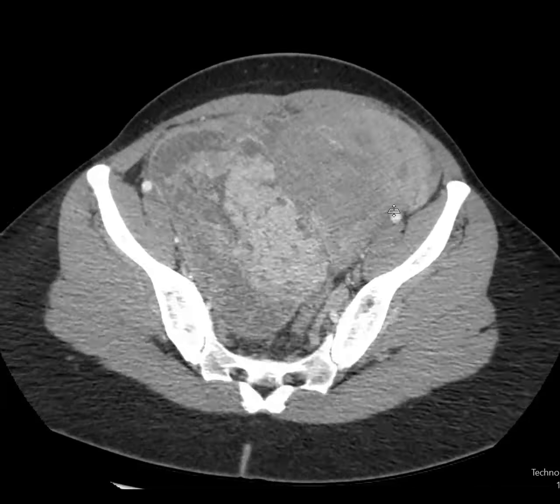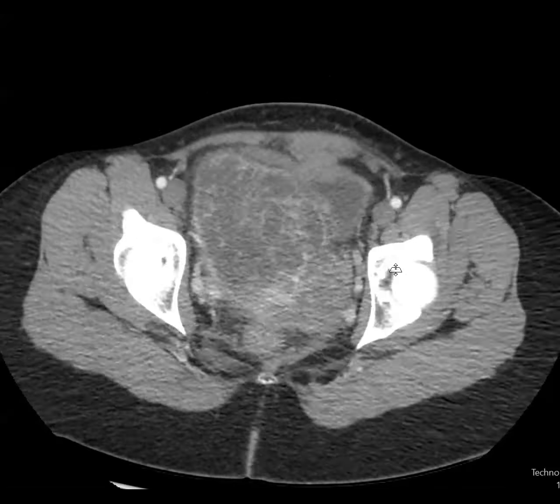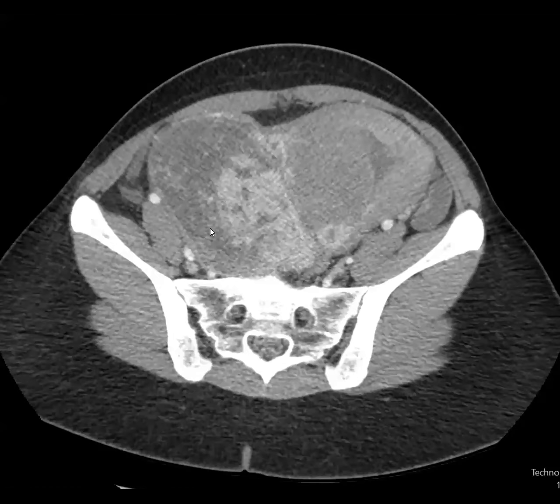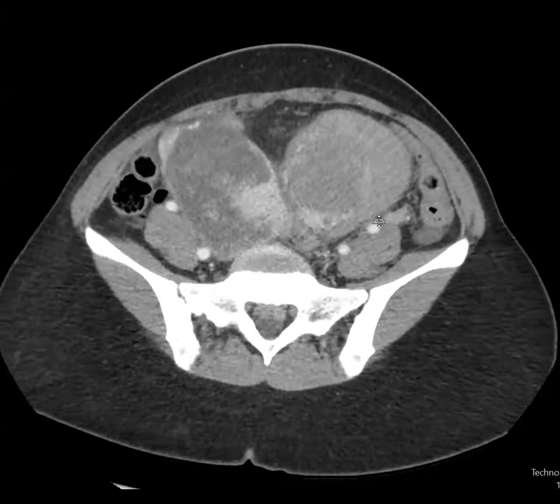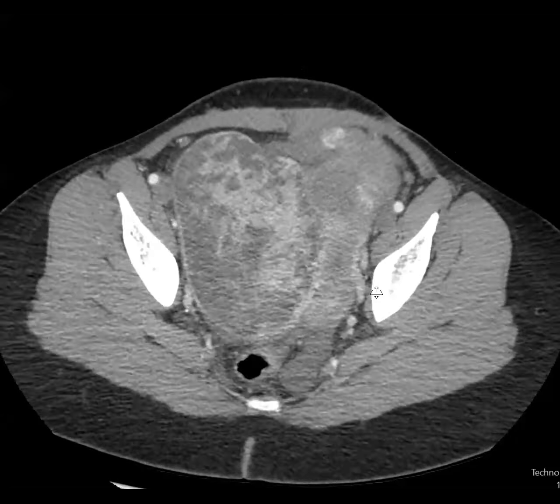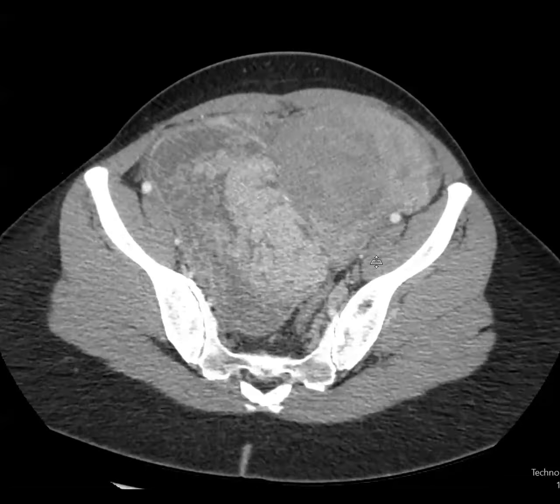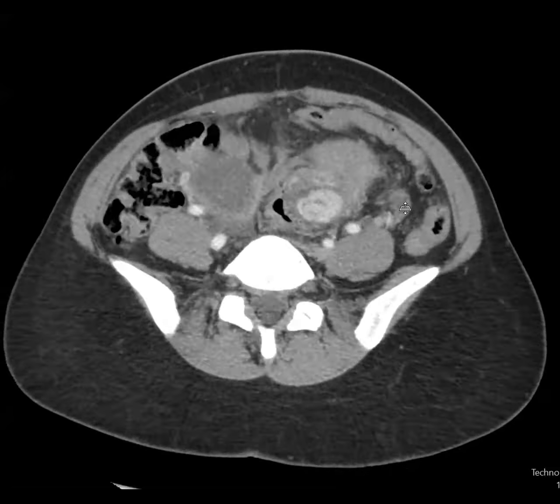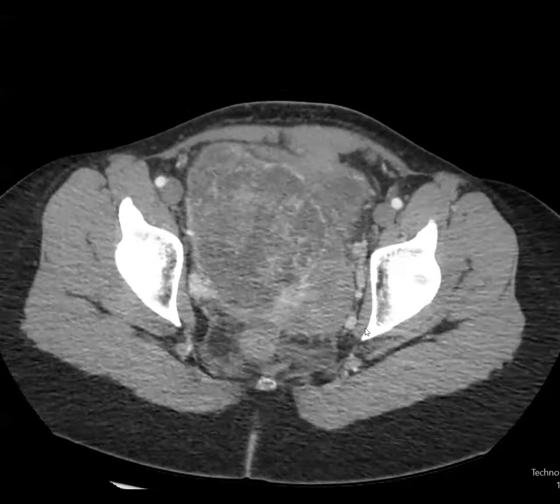So this is kind of like our fibroid versus leiomyosarcoma, right? And it does look very heterogeneous, but it's well encapsulated. It doesn't have infiltrative margins. It doesn't have definite intratumoral hemorrhage. And I don't have an ADC value for you because we didn't do an MRI. But I'll just say that this was watched for years. There's some fluid, and lots of stranding. Anyway, it was pretty stable for a while.